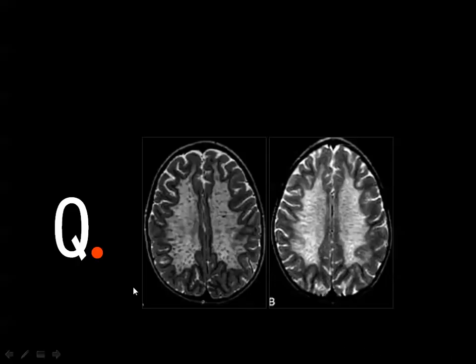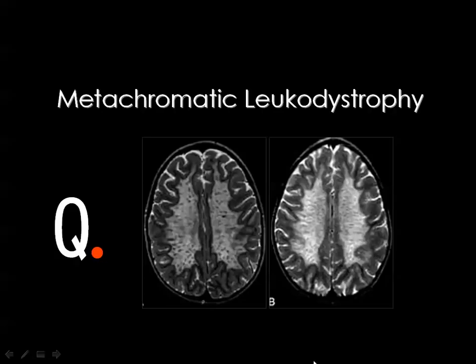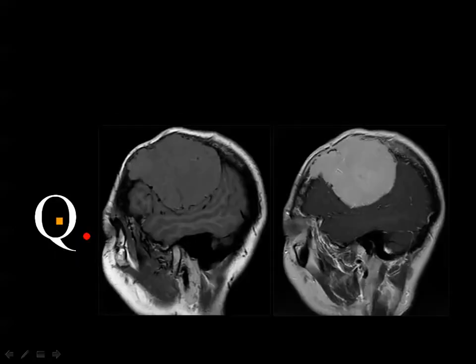Leukodystrophy. Axial T2 weighted MR images showing diffuse white matter signal abnormality with intermediate linear and spotty lesions or areas within the white matter, giving the characteristic tigroid pattern, which is diagnostic of metachromatic leukodystrophy and Pelizaeus-Merzbacher, but metachromatic is relatively more common.